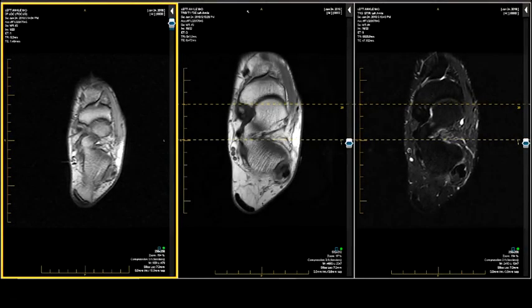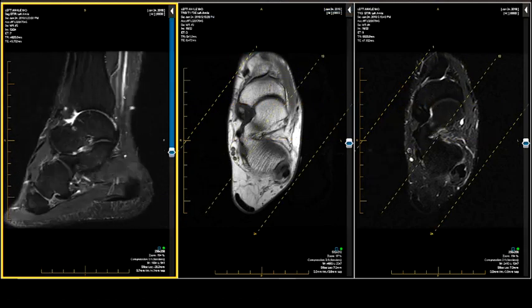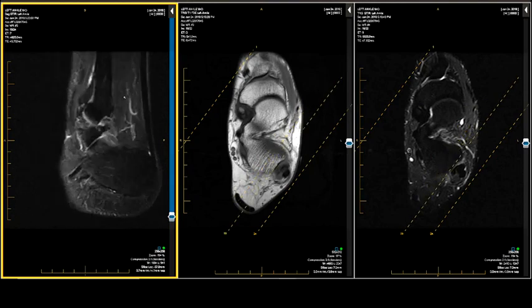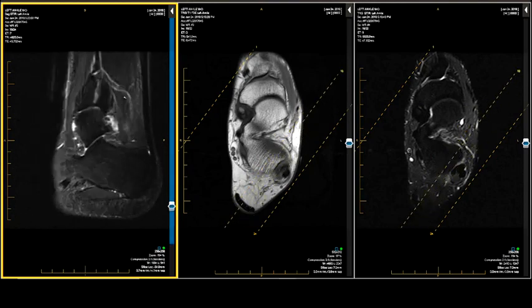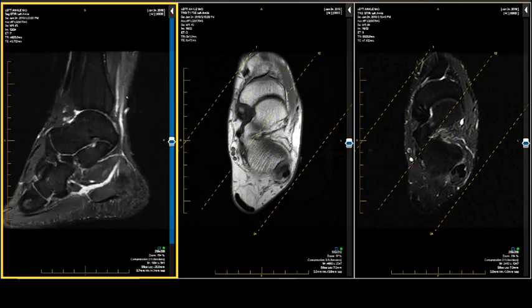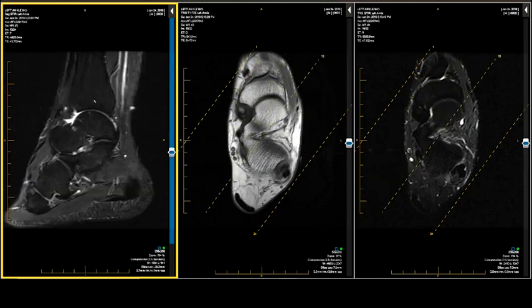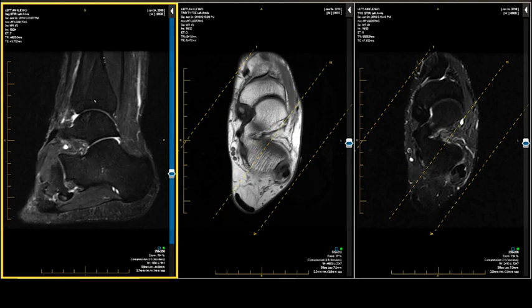We are on a 31-year-old man with pain and swelling after he rolled his ankle. He's got pain laterally, limited range of motion, popping, and numbness. Well, I'll put up my sagittal water-weighted image, as I'm prone to do. So far, I'm not impressed by what I see, but this is a heavily water-weighted image. It's geared towards search.